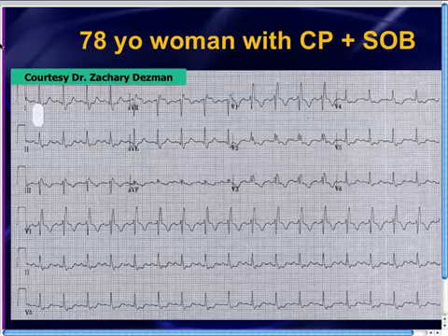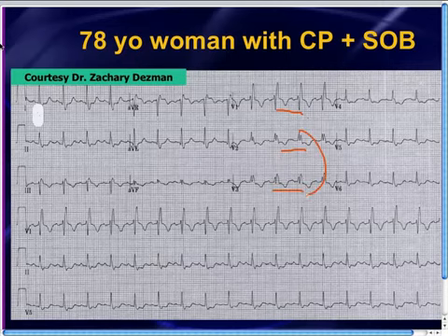And what also you should not normally see, you can see some T wave inversions in V1, V2, maybe V3 in a normal right bundle, but these T wave inversions in V2 and V3 are a little bit more than you'd expect. And also you see T wave inversions in all of those inferior leads, and that's not normal with a right bundle. Right bundles, by the way, can sometimes produce T wave inversion in lead 3, but really shouldn't produce T wave inversions in all of your inferior leads.